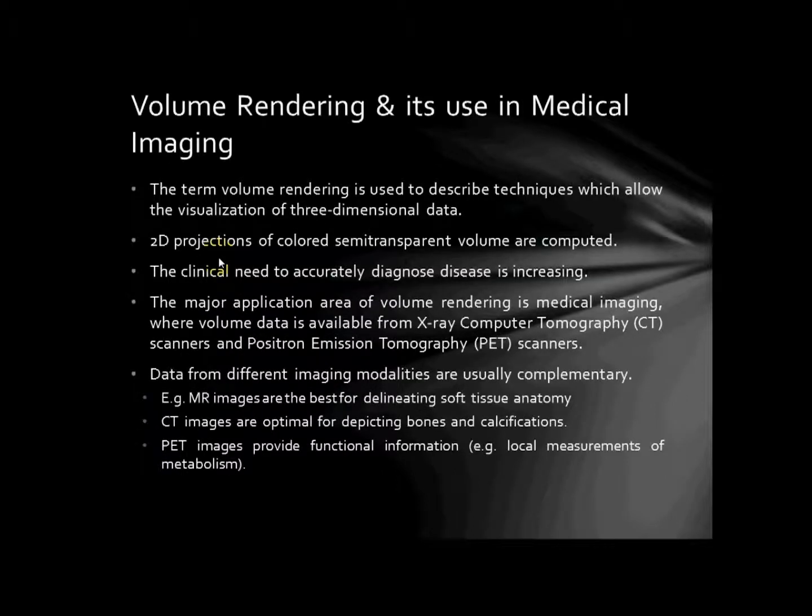Now, what is volume rendering? Volume rendering is used to describe techniques which allow visualization of three-dimensional data. In volume rendering, we calculate a 2D projection of colored semi-transparent volumes. The major application area of volume rendering is medical imaging, where volume data is available from X-ray computed tomography scanners and positron emission tomography scanners.